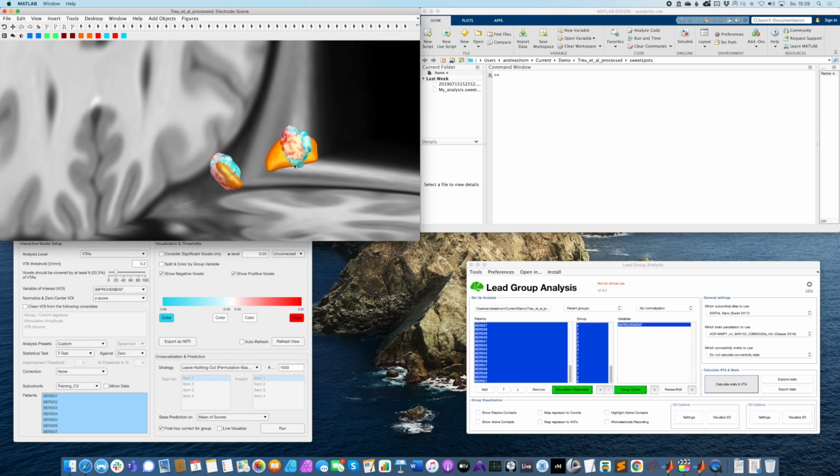Okay, so again, this is not at all significant. This is a model that we currently have on the stage that we can now explore further.